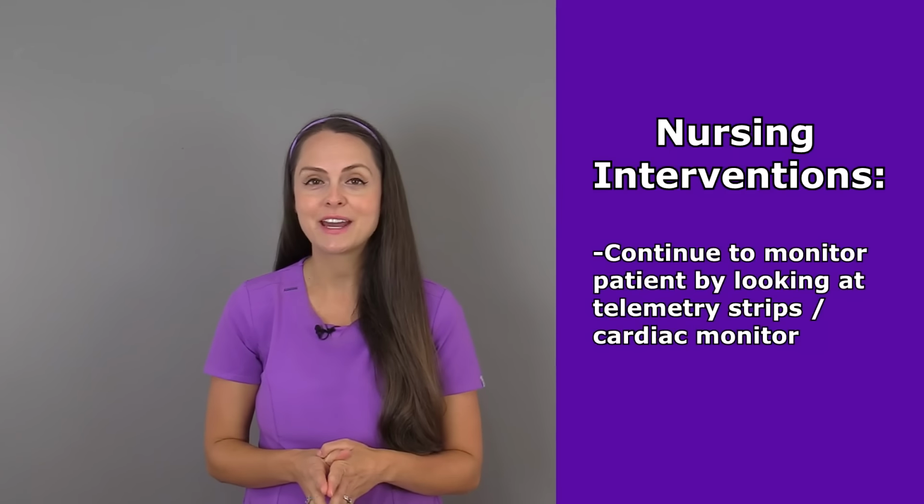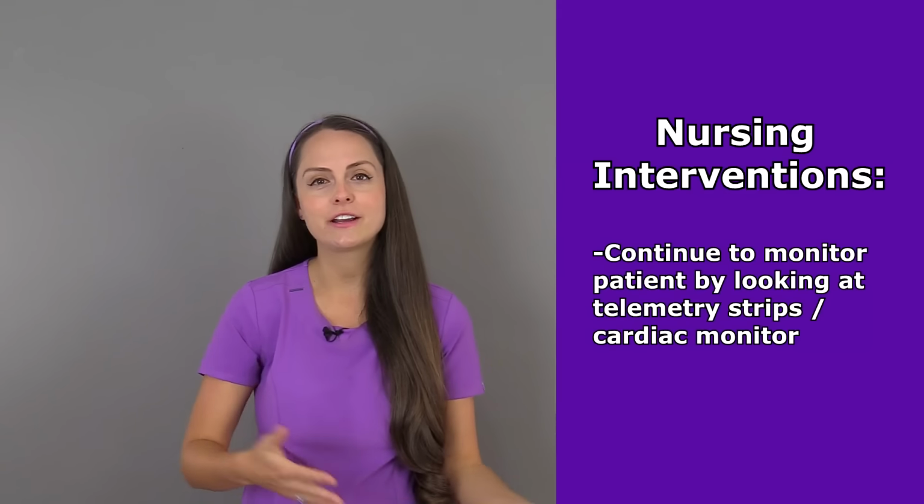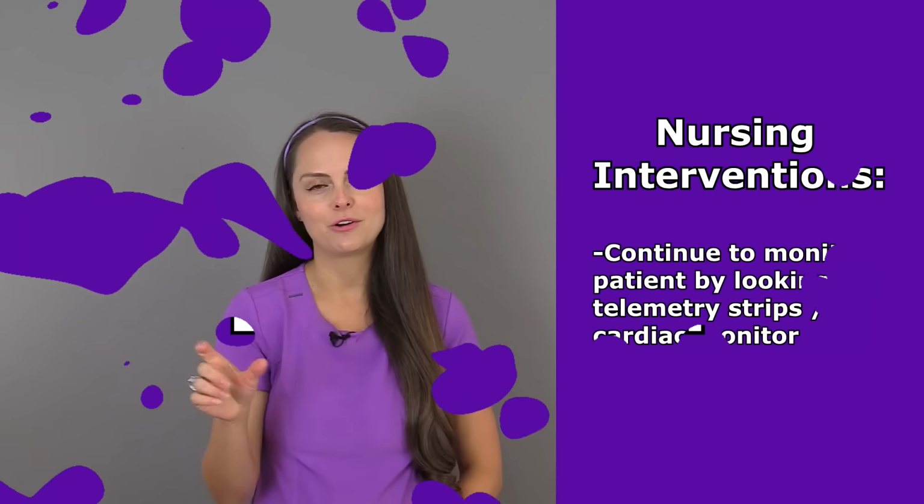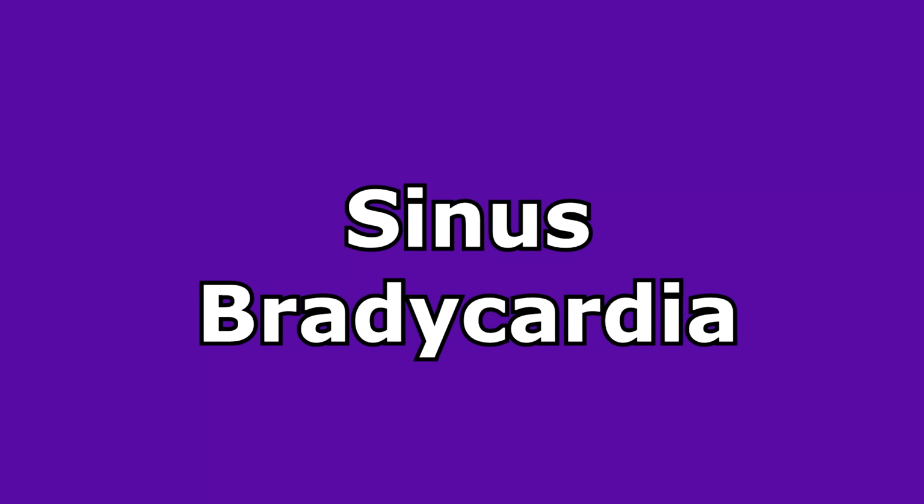Because many times patients do. They may go into atrial fibrillation or sinus bradycardia or sinus tach, or they develop a heart block where that PR interval is prolonged. Next, let's look at sinus bradycardia.